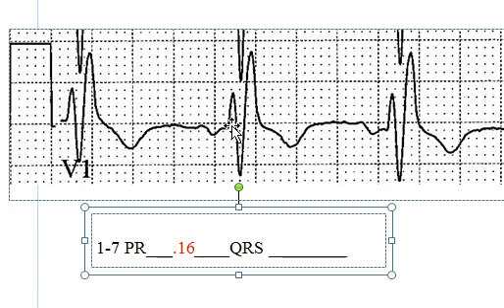QRS includes all of this here. So the QRS begins, see we have the P wave, it went up, it went down, and then there's a little straight line here. And then it very sharply veers from the line and goes straight up. That is our R wave. So you'll start measuring then. It drops down, drops below the baseline. So that's what we call an S wave, as it follows the R wave. And then it jumps back up again for a second R wave.